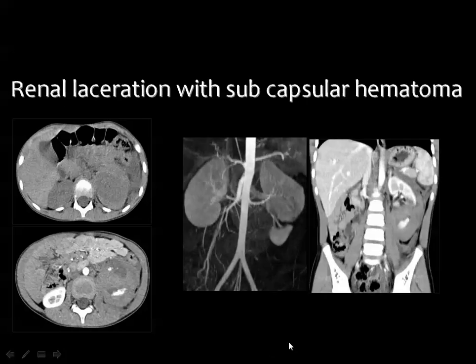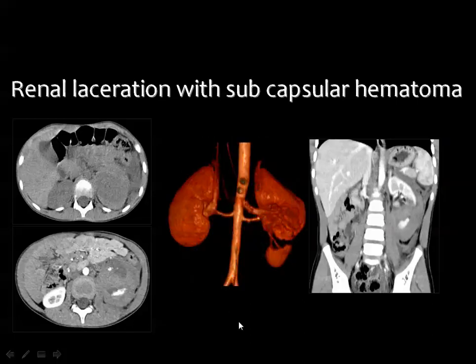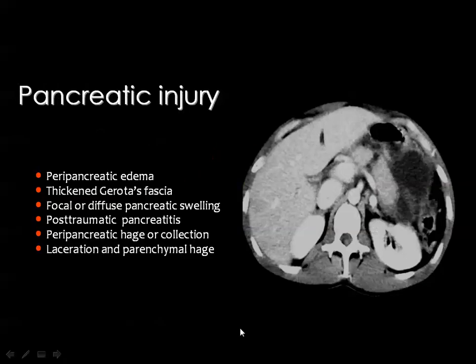Then using the reconstructive capabilities of the multi-detector CT, you can appreciate the very deep laceration in the lower pole of the kidney and the excessive hematoma surrounding the kidney. Of course, you can obtain these images in color as you know.